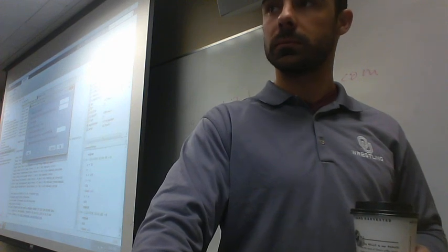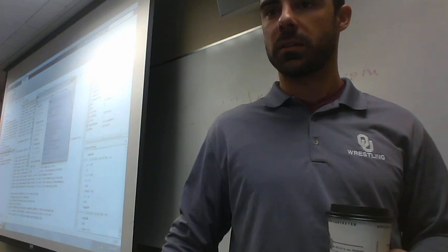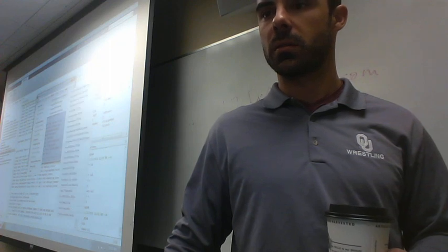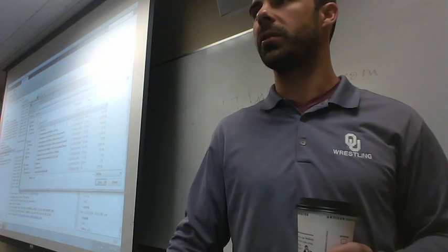Can you go back to the file section? Sure. Cancel out of there. It's just this one here, 3.BDF. It's the only single one that there's an option for.